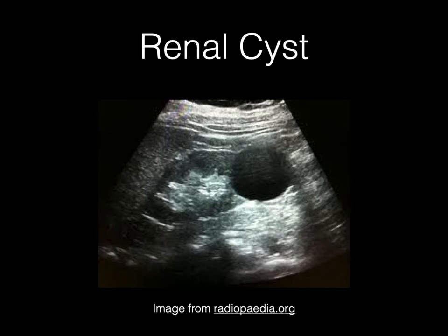Here's an example of a renal cyst. So these are completely common. When I see one in a patient, I inform them. I might put it in their note and then send their primary care a follow up that this was an incidental finding, but these are incredibly common.